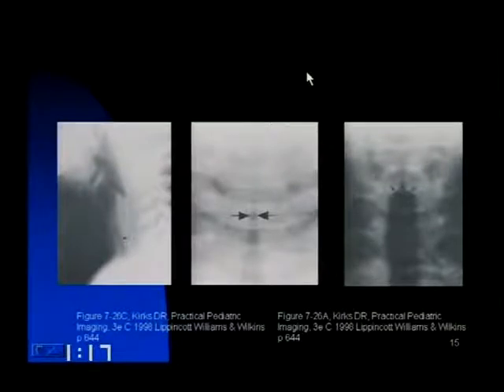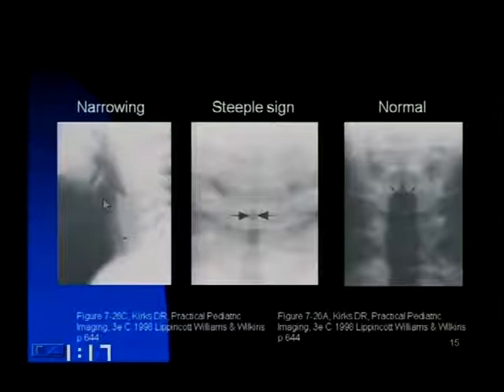Soft tissue radiographs of the neck. The AP is key, and it shows distension of the hypopharynx, a normal epiglottis, seen here on the lateral projection, a symmetric subglottic narrowing as evidenced by an inverted V or steeple sign, as opposed to the normal shouldering, and this is croup.